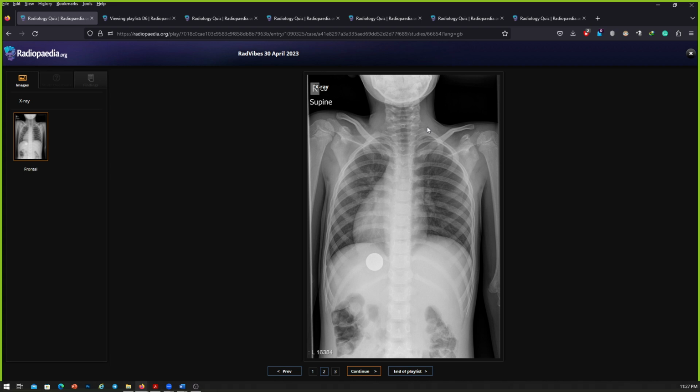So I have been provided with a radiograph of a patient, including AP chest and upper abdomen. I can see that there is dextrocardia, as the left ventricle is pointing towards the right side. Since the patient is dextrocardic, I'm looking in the lungs for any abnormality. I can see some reticular opacities in the left lower lobe, which may represent bronchiectatic changes. However, in my routine practice, I will zoom out these images and review them.